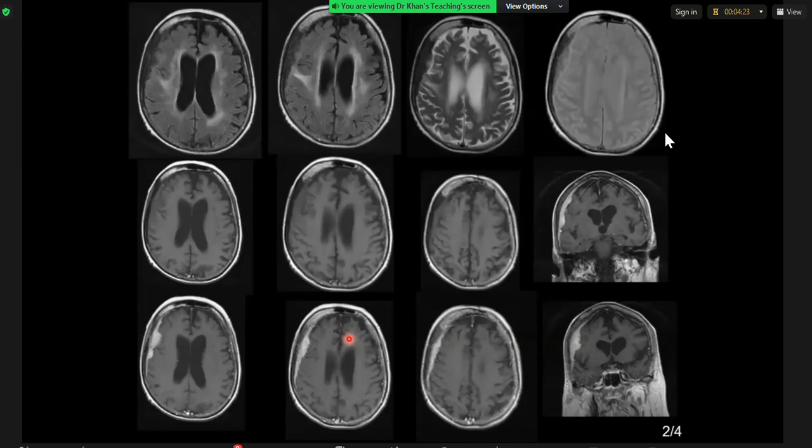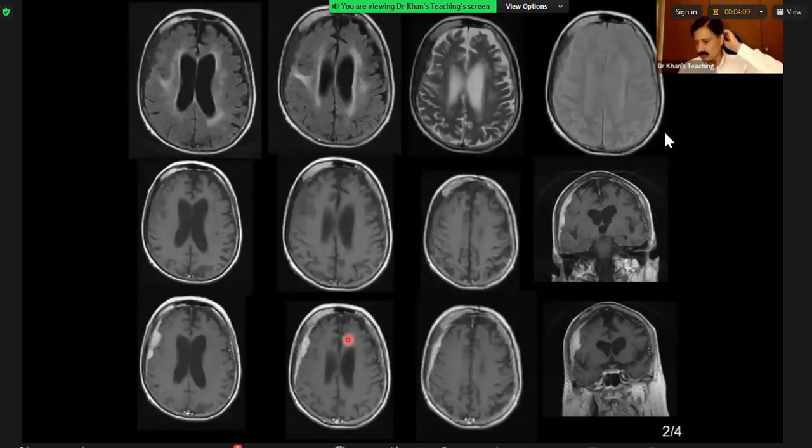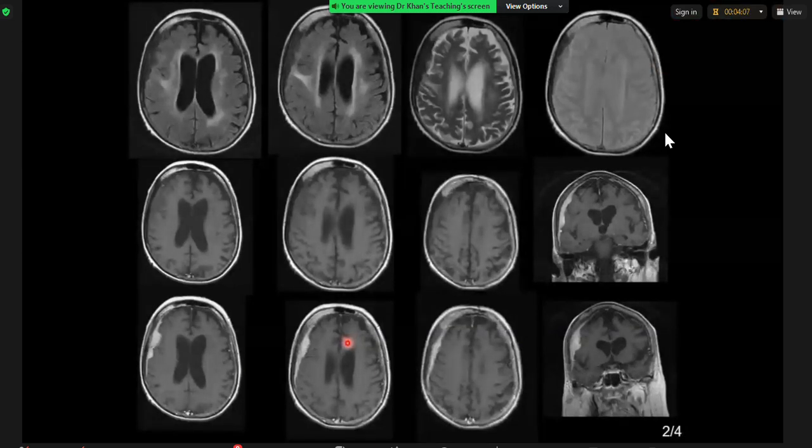It's got a very nodular appearance. And I also note that there's loss of the normal fatty marrow in the diploic space in the overlying calvarium. Very good. So I think this is a dural metastasis with bone invasion.